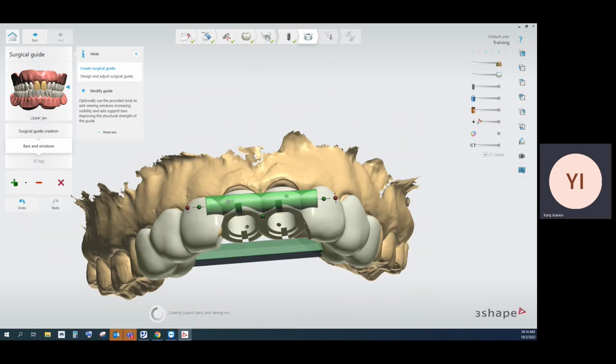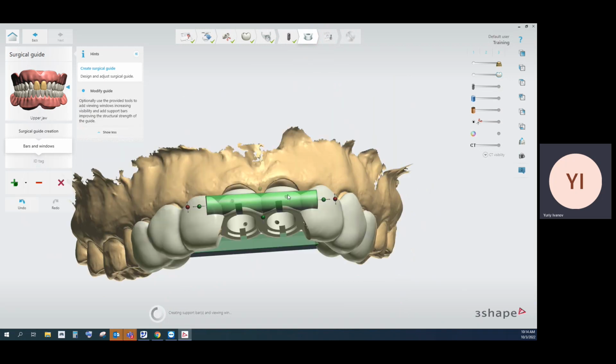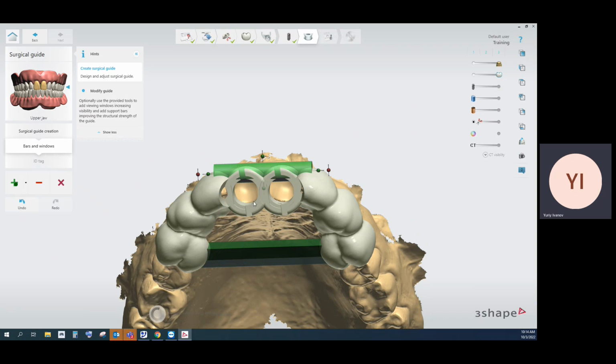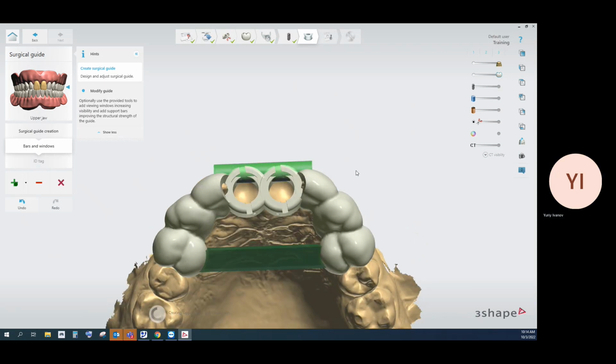And no worries about covering some holes or marks, because they are going to be calculated and subtracted by sleeves and parameters.